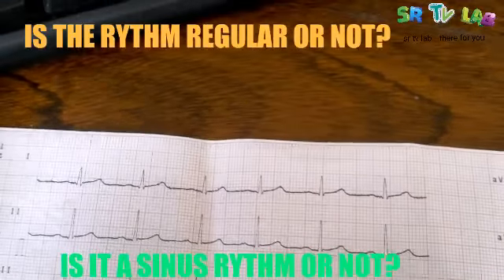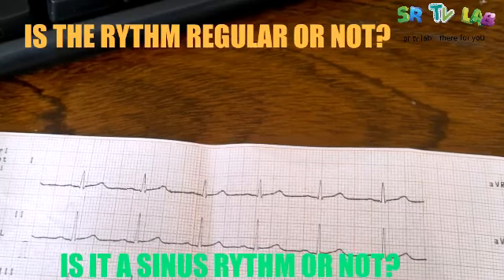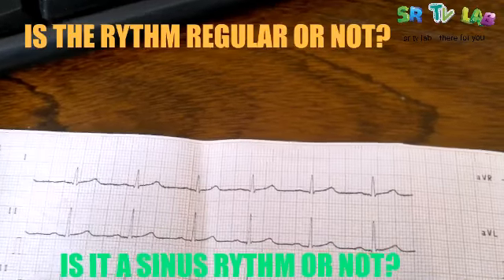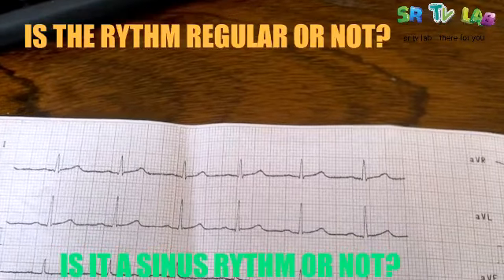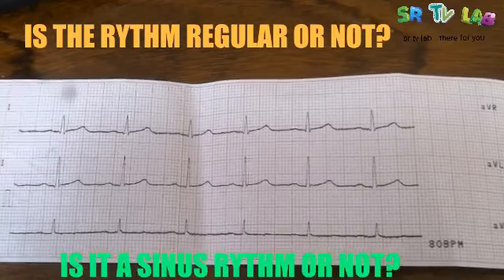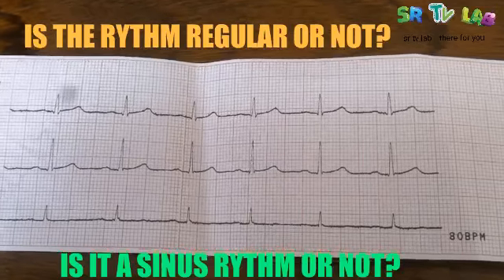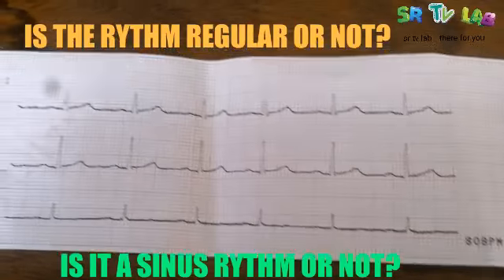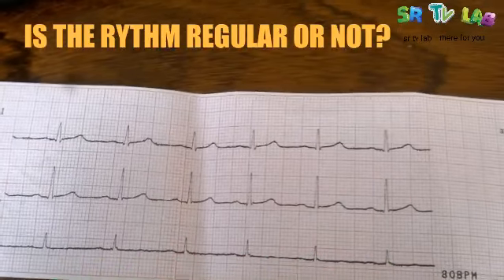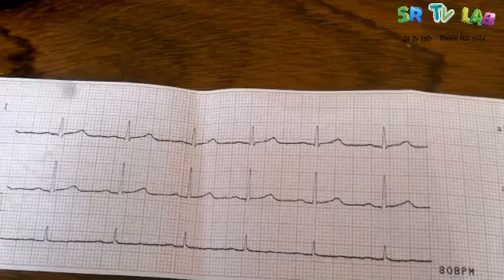Also, we'll see the ST segment. We'll calculate all the things related to it, even QRS intervals. We'll check if the T wave is good, the ST segment, everything. And another most important thing we will see is the axis deviation determination, to see if the cardiac axis turns toward the right side or the left side. We will come out with it in the next topic.